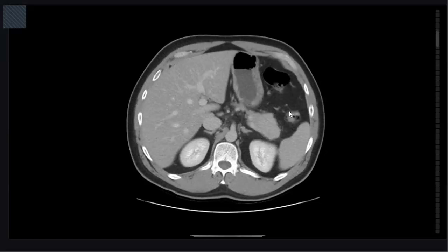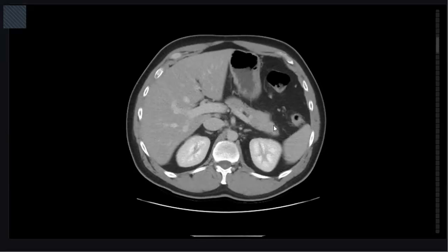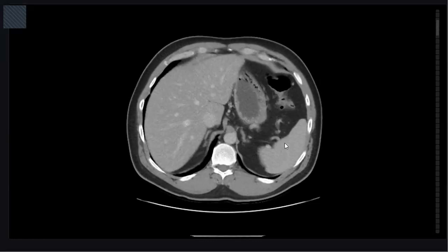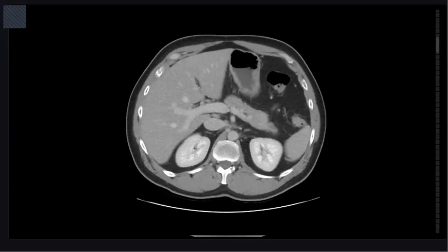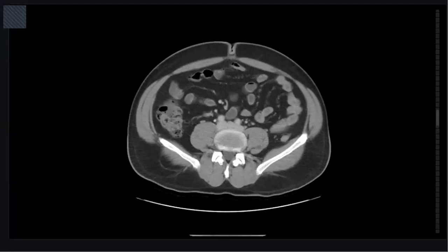Here you can see the pancreatic tail is prominent and there is loss of the lobulated appearance of the normal pancreas. However, we couldn't appreciate any mass lesion in the underlying pancreatic parenchyma. So likely to be inflammatory other than neoplastic, Dr. Sameh. Sometimes there is no fat stranding. This really is a case of focal autoimmune pancreatitis, IgG4 related. So not so much stranding, just a bulky pancreas.